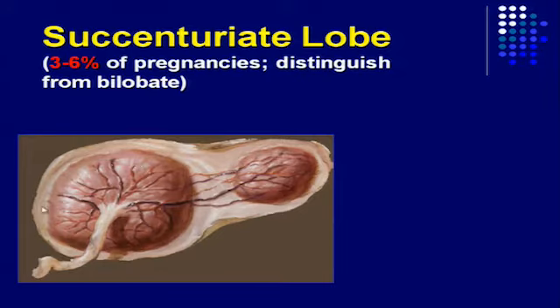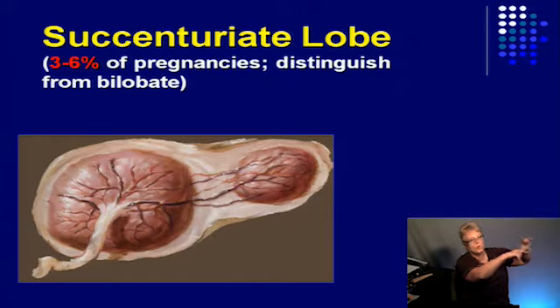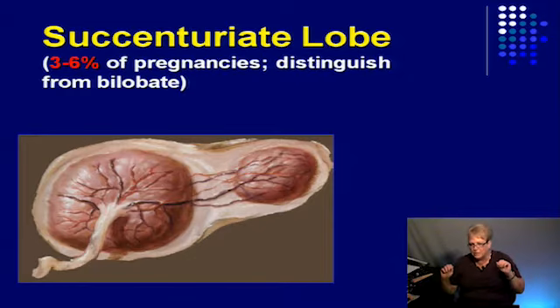So you have your main placenta, and then you have the cord inserting into that placenta, and then you have these little vessels that go to this little accessory lobe. Because in the beginning, remember when you have early implantation, you have chorionic villi all around that little blastocyst. Where the implantation occurs, that's where your cord is, and the chorionic villi start to proliferate. The rest should atrophy. Well, sometimes there's some that say, I don't want to atrophy, I'm going to have my own little thing. And then you have these vessels connecting.